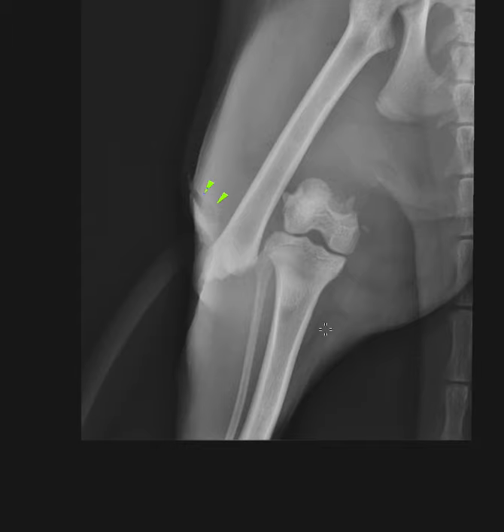So the other term that I used was overriding. I tend to use the term overriding when I think that not only is the distal fragment of the fracture displaced from the proximal fragment, but they've actually come together so that they're now almost superimposed on each other. So that would conclude my fracture sentence for this case.